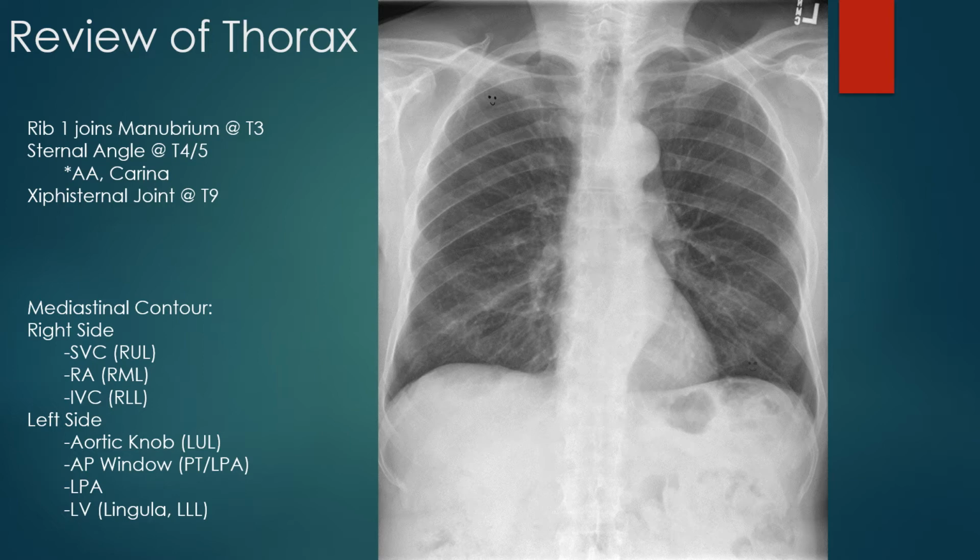So in the PA radiographs, they are PA instead of AP because AP can artificially enlarge the structures. I personally like to review bones first and then move on to softer tissue structures, but no matter how you do it, it is important to be systematic.